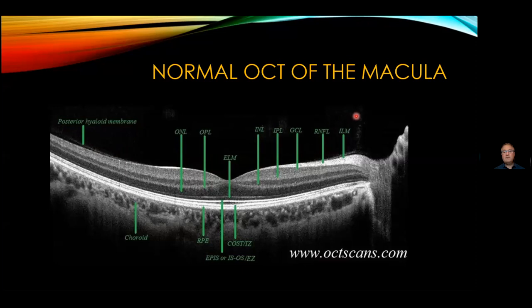We can even evaluate some vitreous features of floaters in that some gel sitting there. There's another piece of gel on the top there. In this slide, we also have a part of the nerve, but this is physically developed to evaluate the macula. The nerve would have a separate imaging to evaluate that.